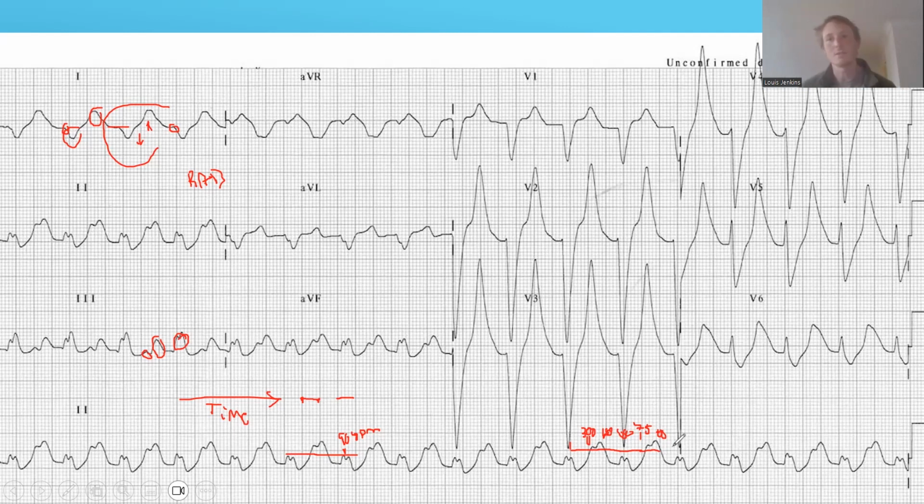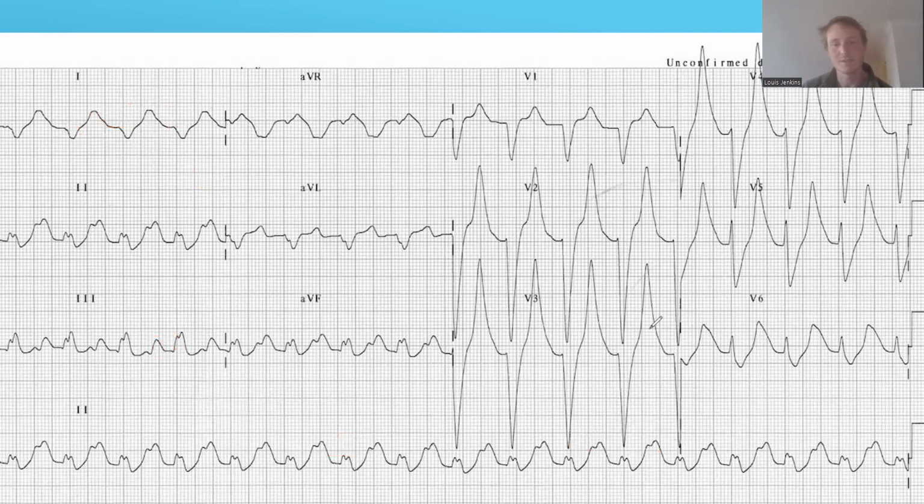So you kind of just have to remember those numbers. But if you don't, you can just Google it on your phone, ECG rate, Google images, and it'll come up. You do that like 10 times, and then you'll have committed it to memory. There's probably a clever way to remember it, but I'm not clever. But anyway, you can use that as a way to approximate your rates of ECGs. It's a guesstimate thing. It's not fully accurate when they don't fall exactly on the line, but everyone's just reading it for monitoring when it comes to rate anyway, and that's fine. I wouldn't bother trying to remember any of the other various formulas that you can use to figure out rate. It would be wasted brain space.